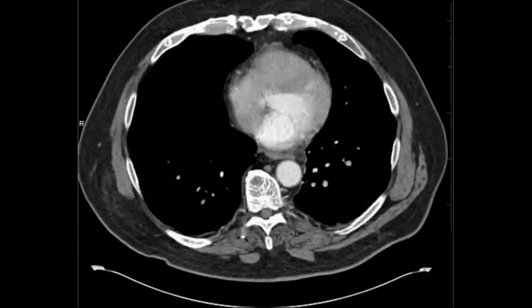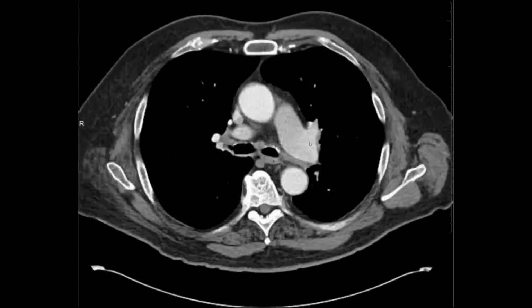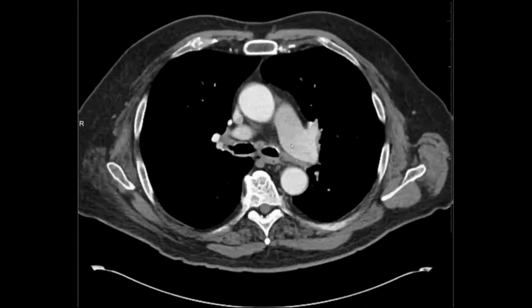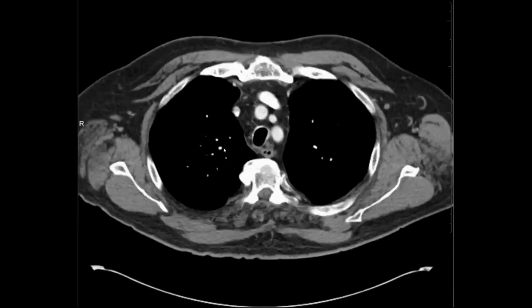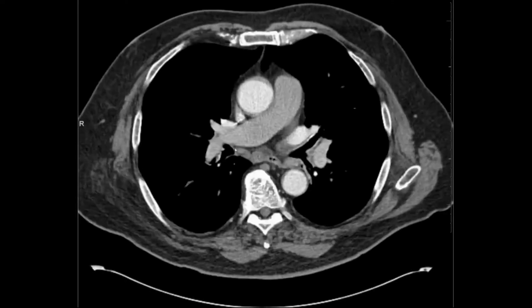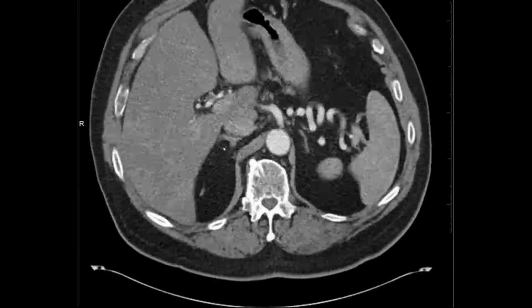And so again, this is the first time this patient's coming in, so I would be a little bit cautious based on the degree of spread here that this person's going to have metastatic disease. I want to do a quick view of the pulmonary arteries again. This isn't great evaluation for a pulmonary embolus, but you could catch the larger central or lobar lesions here.